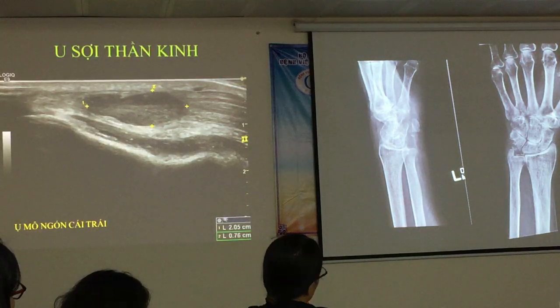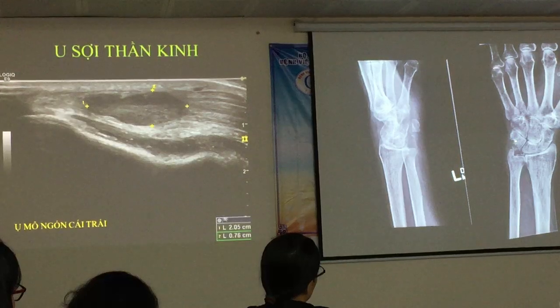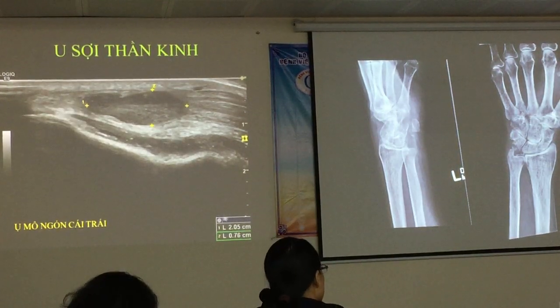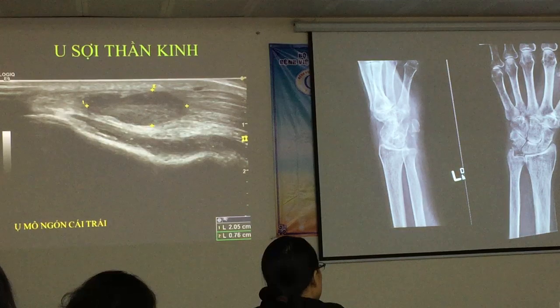And this was the resulting X-ray on that, so you can see once again a lot of degeneration within the joint, lots of crystalline changes, bony erosion. So this lady also presented with a history of gout, so it was more of a case of is it gout or is it something else.